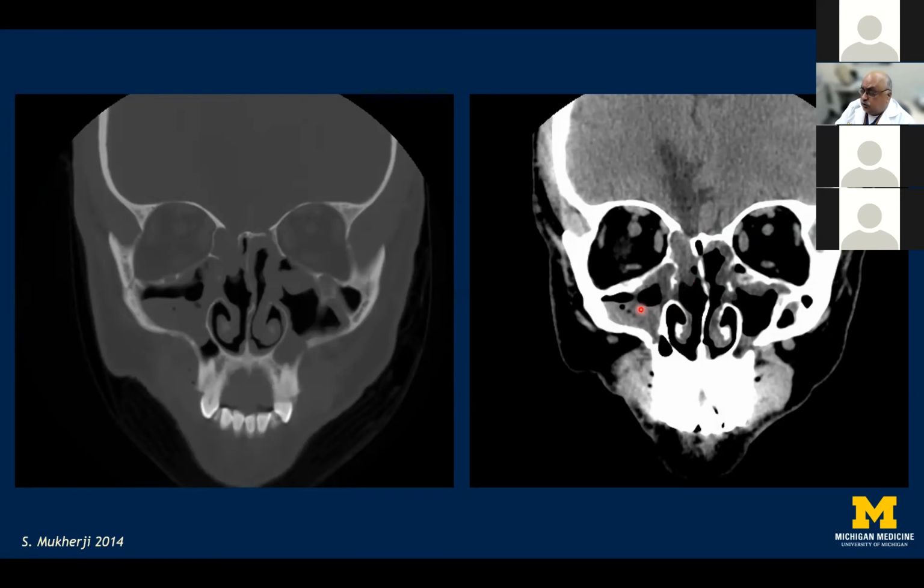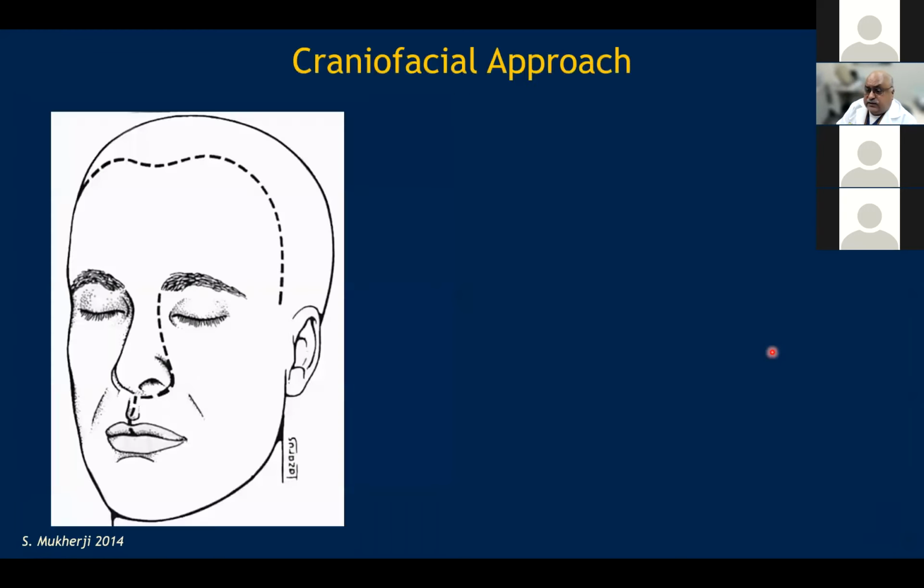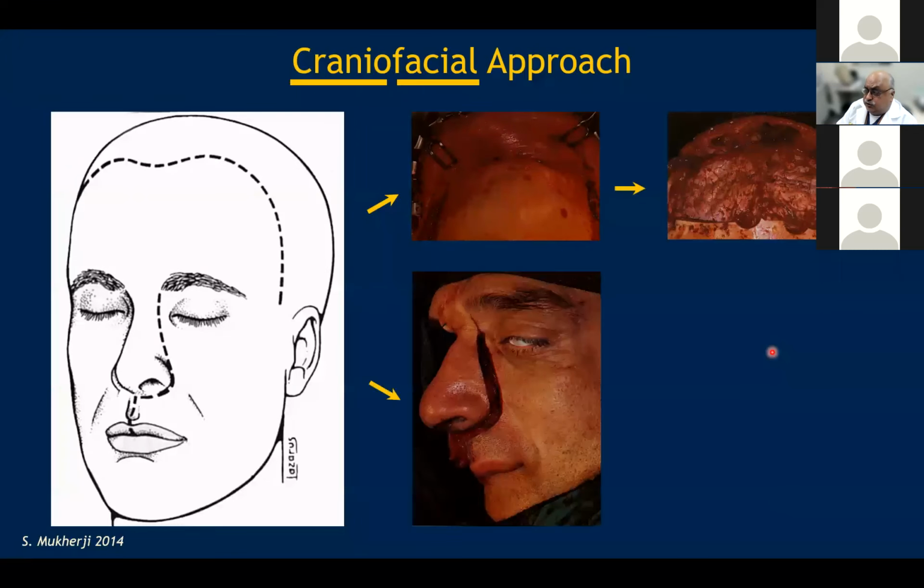And in this patient who was scanned in the prone position, one can see the dependent fluid levels in the maxillary sinuses, which suggests that there is an active CSF leak. And this then entails an emergent management for this patient who has this active CSF rhinorrhea. Once we have the anatomy in place, we can then plan out our surgical approaches as well.